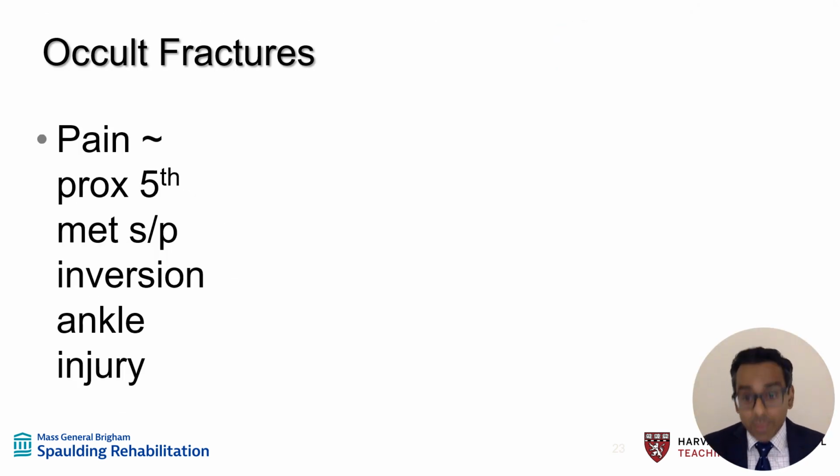We're going to wrap up here by talking about occult fractures and how we can find some of these fractures with ultrasound instead of the classic modalities such as x-rays or MRIs. And more likely, I'll show you how the ultrasound really acts like an adjunct to those other modalities I just mentioned. So the first case we're going to discuss here is a patient who has proximal fifth metatarsal pain after an inversion ankle injury.